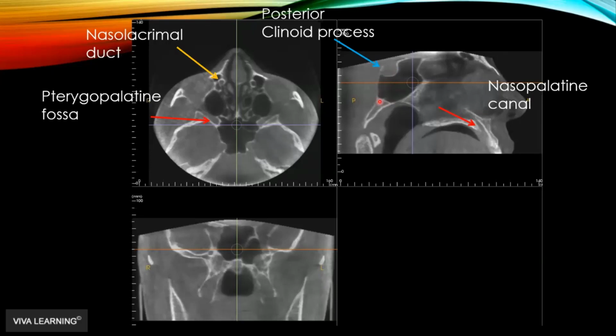orthodontist. This is our sphenoid sinus. We'll point it out in a moment. This is the clivus, which comes down to the tip of the odontoid process. You kind of want to see, it's almost like a ski slope. You're supposed to be able to slide down that clivus and sit right on top of the odontoid process, which is C2, and this is the arch of C1.